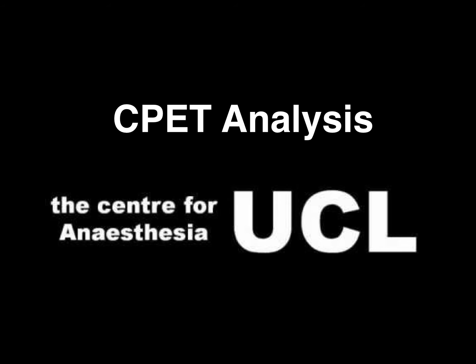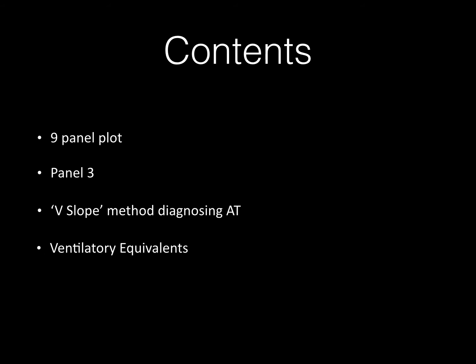In this short podcast, we're going to talk through some of the basics of cardiopulmonary exercise testing, or CPET, interpretation. We're going to look at a 9-panel plot and then zoom in on the top right-hand plot, plot 3 in this configuration. We're then going to look at various ways to diagnose or determine the anaerobic threshold, the V-slope method, the ventilatory equivalence, and then we'll also look at a graph showing the respiratory exchange ratio.